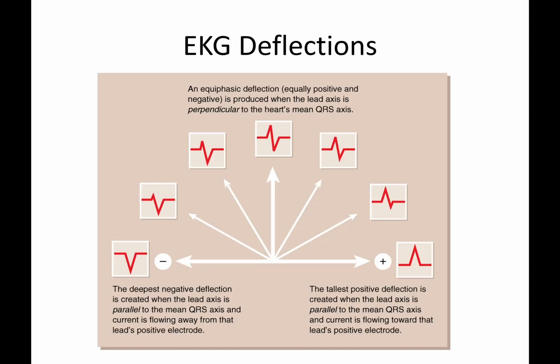So let's take a look at this to kind of put it into better words or make more sense out of it. Right here we have just some generic deflections based on their relationship to one another.